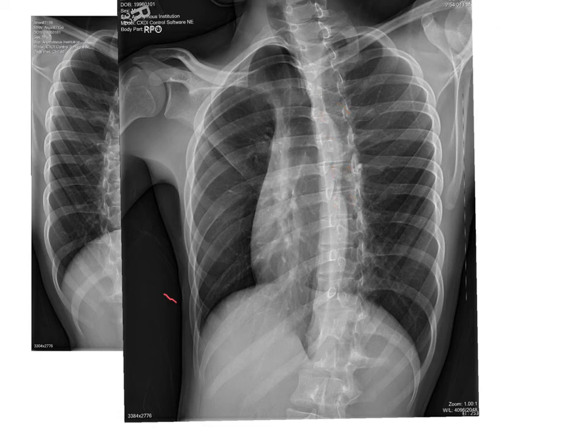Let's look at the sternum in this image. Here are the ends of our clavicles, so our sternum is going to be right about here. We don't see the sternal angle too much, but look how close this sternum is to the spine. There's not a lot of distance. I personally, as a technologist, would have rotated this patient a little bit more. They don't appear to be quite 45 degrees rotated.